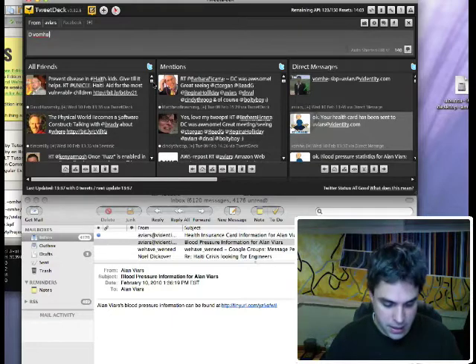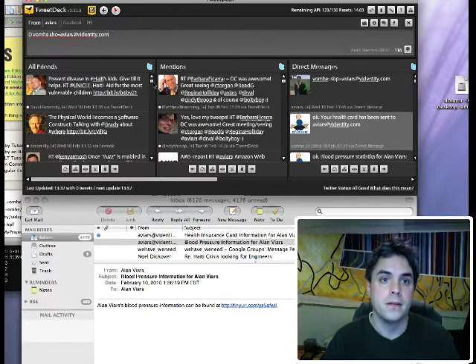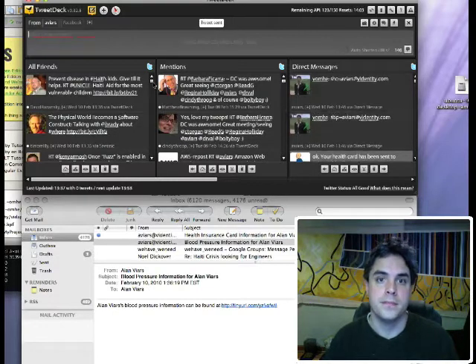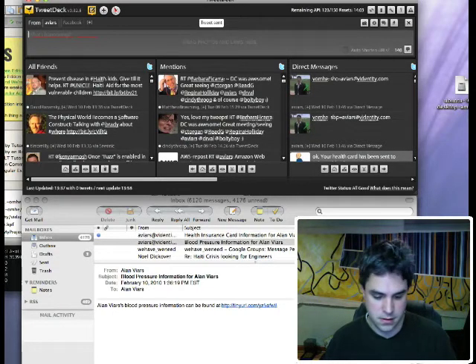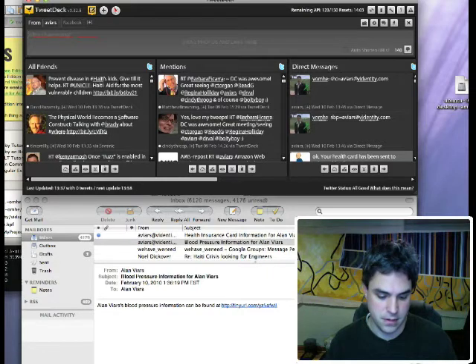And similarly, I can actually send my health insurance card. So in just a few moments we will get responses for those things.